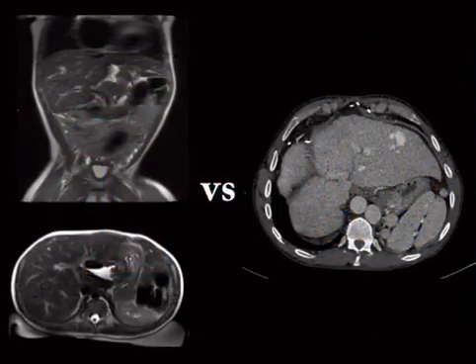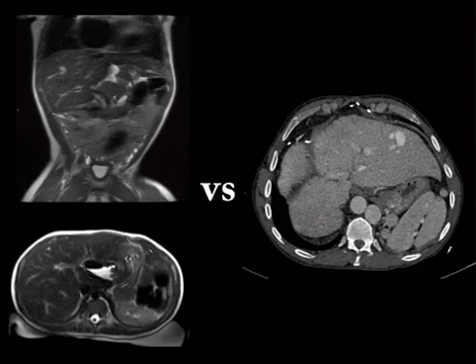Start out with the this versus that here. So what we're seeing over here first is too many spleens. So this is a polysplenia case. You notice something weird's going on here, right? And then over here, looks like we don't have a spleen. So this is our asplenia case. So what these are is these are heterotaxia syndromes.